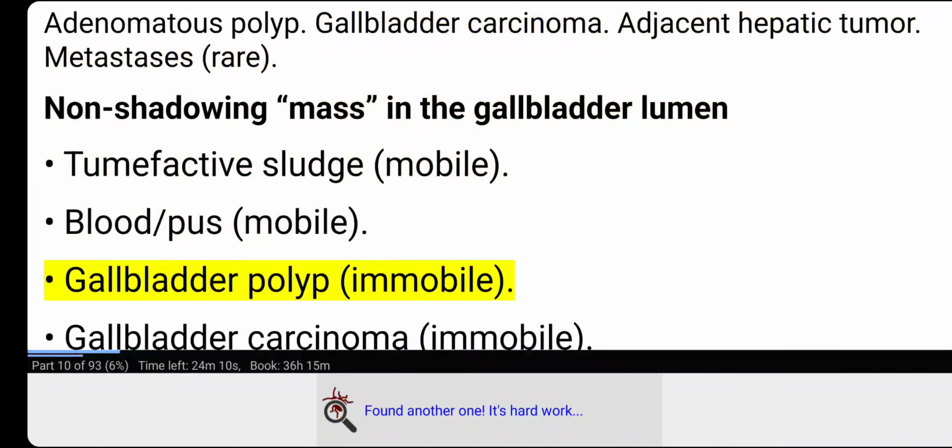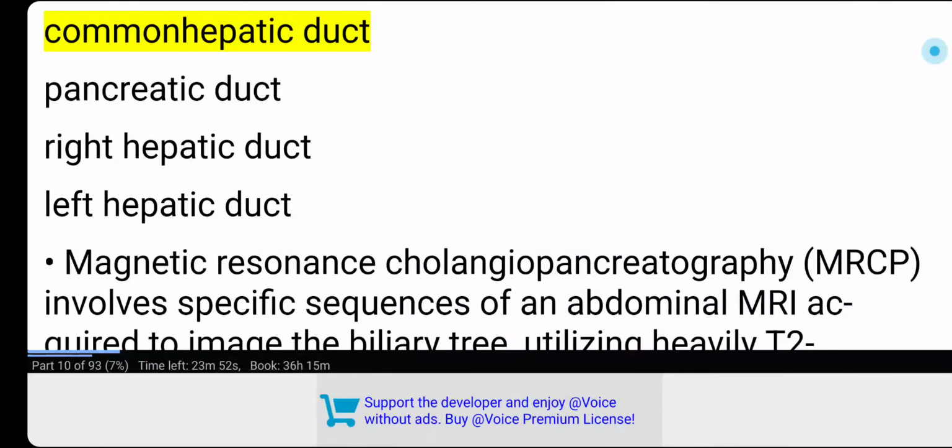Echogenic gallbladder wall. Porcelain gallbladder. Gallbladder full of stones, wall echo shadow sign. Emphysematous cholecystitis. Magnetic resonance cholangiopancreatography, MRCP. MRCP overview. Cystic duct. CBD. Common hepatic.